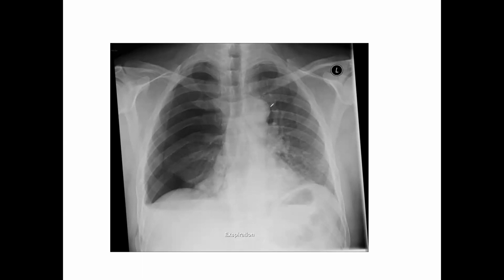And I told you a while ago, if the arm is not moved out, the scapula is not moved that way, you might see a distinct line based upon the scapula. So I'm going to trace this line right here that you might see. That is the shadow from the scapula. So what I've outlined there is your scapula. You can see the spinous process throughout, so that's good.